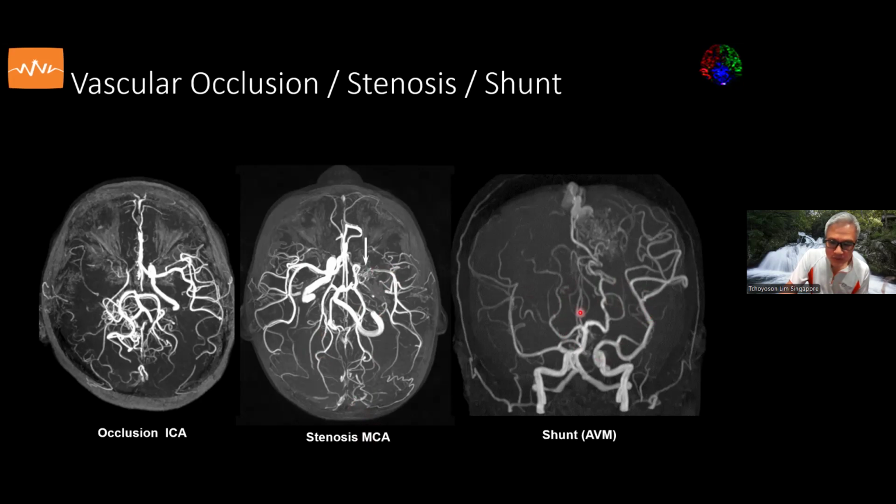This is a patient with an AV malformation, which shows that the PCA does not decrease and taper in caliber like most normal blood vessels, but instead has a thick arterial supply into the nidus and early draining vein into the superior sagittal sinus.